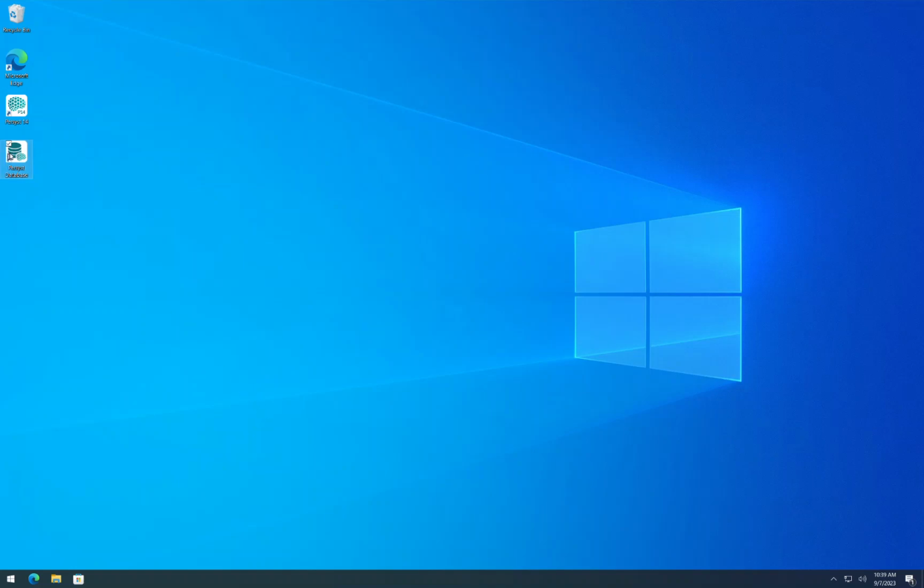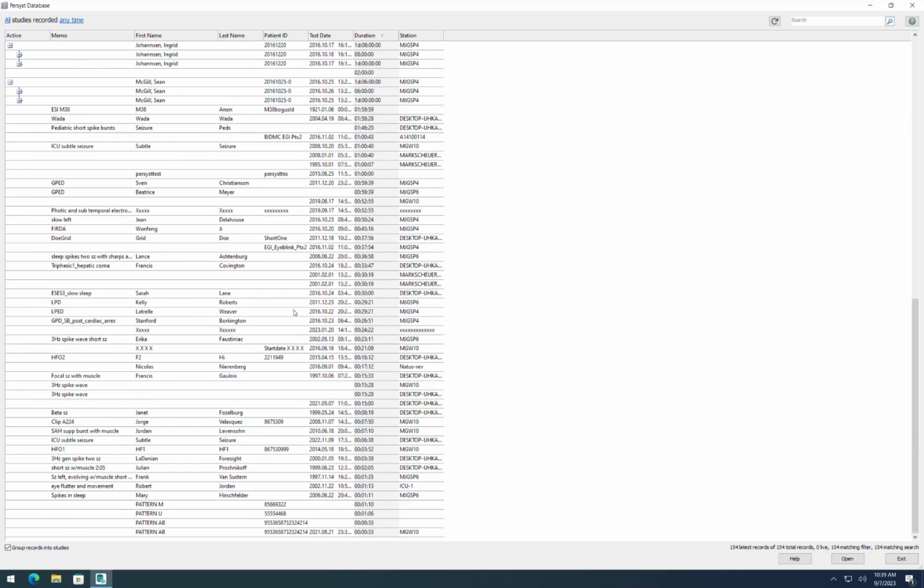Let's get started. One of the things I did in preparing for this, since I had already gone through and done some work on this recording, is I removed some of the trend results and spike detection results so we can have a clean start on that.